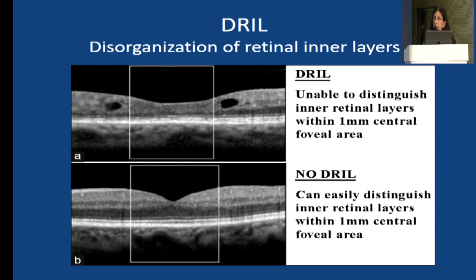Drill is another terminology. Here, that was in the outer layers. Here, the disorganization is of inner retinal layers. So here you cannot differentiate. You can differentiate the layers here, you cannot differentiate here.